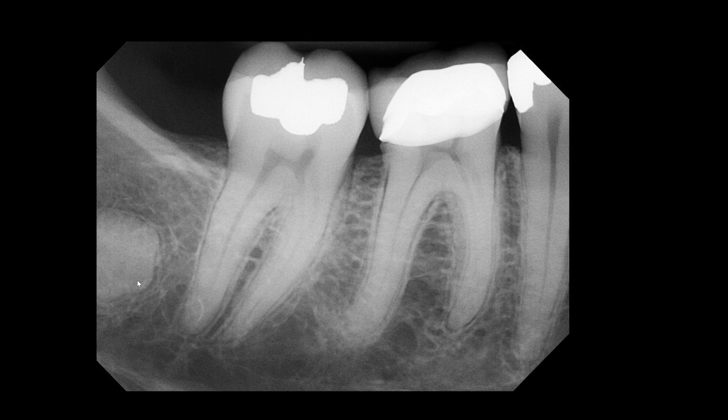I didn't have a chance to ask, but you can ask whether this patient has had his or her third molars taken out, and the patient might be able to recall that not all root tips were entirely removed. If that were the case, you have the answer right away. I think that should be the first thing we consider: perhaps incomplete removal of number 32, hence a root fragment of number 32.